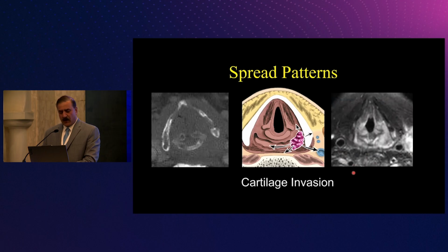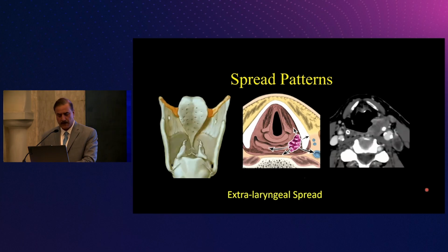This is just the MR of what we saw on CT. Here again, you can see the tumor cannot go out through here, so it is extending anteriorly through the notch, and it is getting into the larynx. And if the larynx is also fixed, that is definitely a T3 disease. And you have this partly visualized node there.